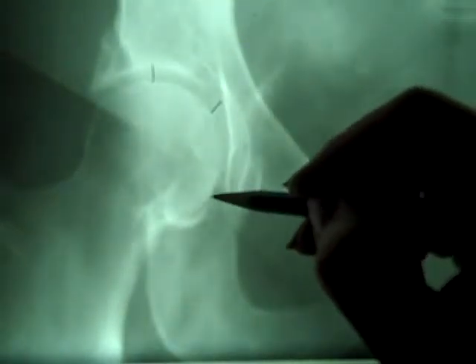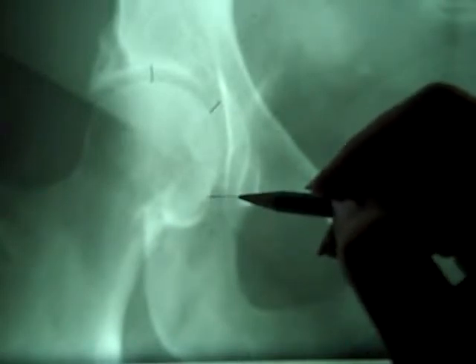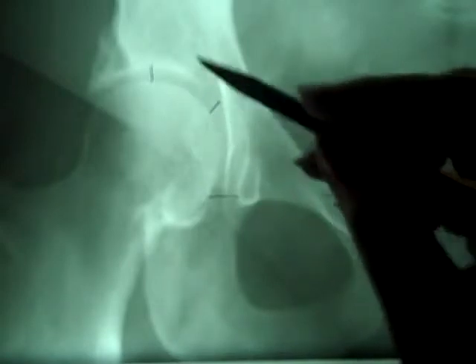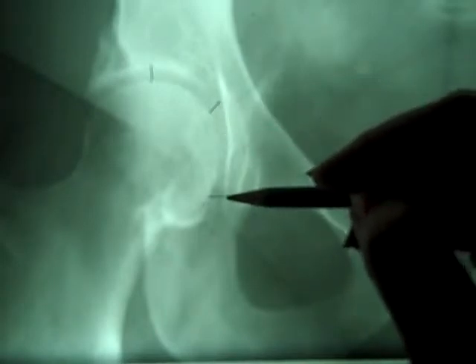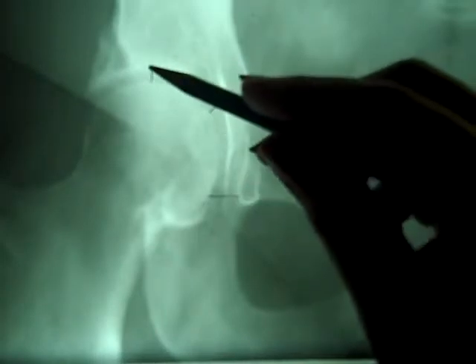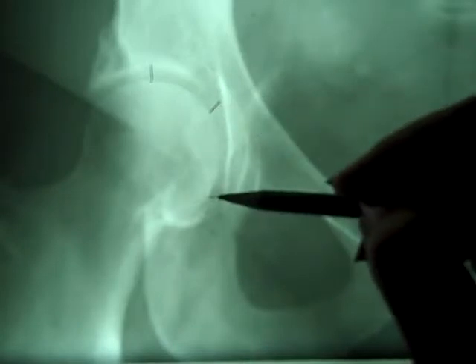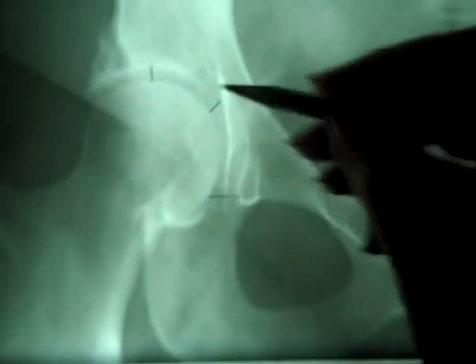Now for medial, just like I said earlier, normal range is 6 to 11 with an average of 9. But more importantly is it should be double whatever the other two measure. So if these both measure 4, then medial should measure 8. If these both measure 3.5, then medial should measure 7.0. Okay? And so we're looking at that.